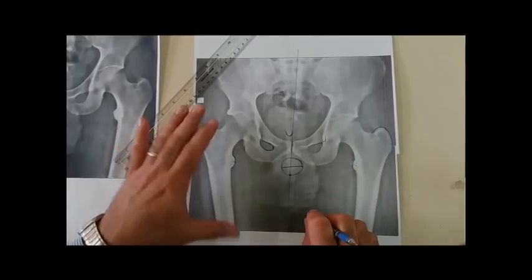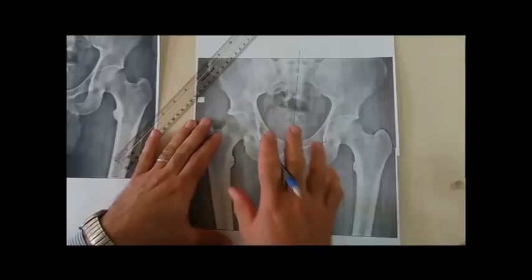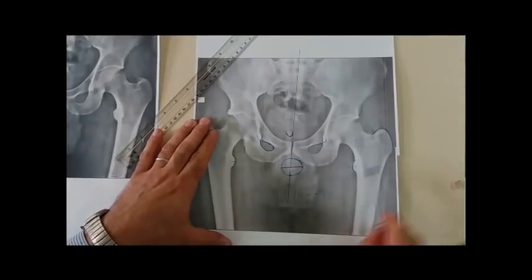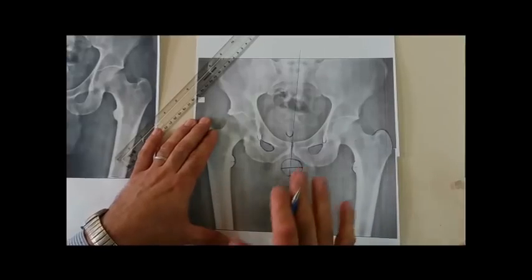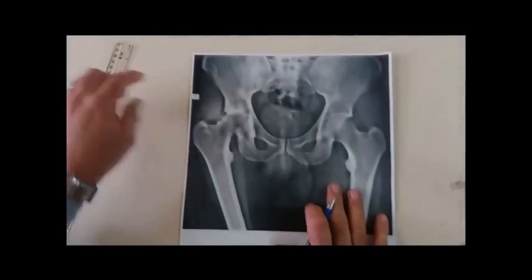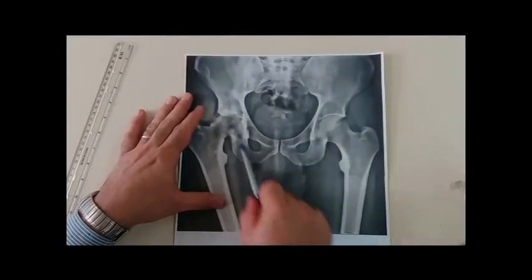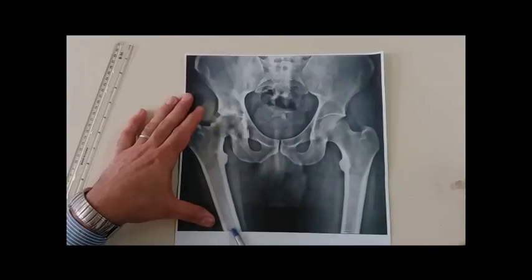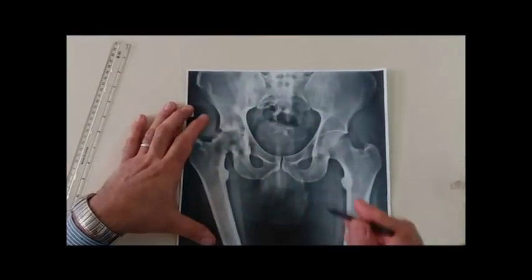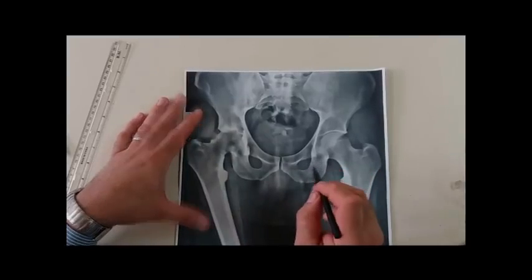So, in summary, step 1 for planning is an adequate X-ray. That means an adequate pelvic side, an adequate femur side, and a well-known magnification. We have finished the first step of templating. The second step would be to draw bony landmarks on the pelvis, as well as bony landmarks on the femur. So the second step is to draw the relevant bony landmarks.